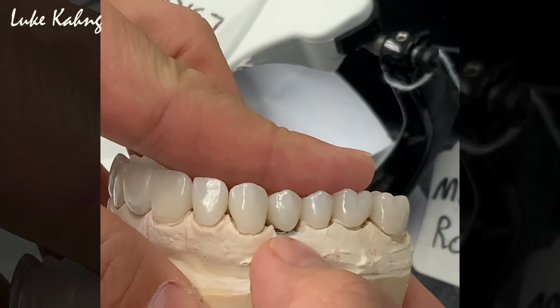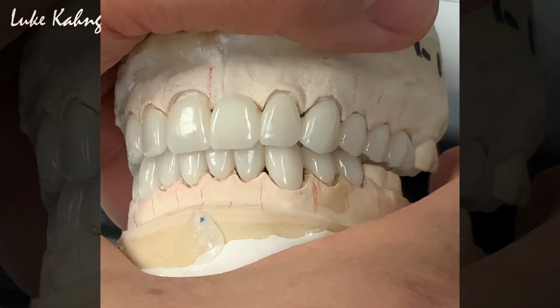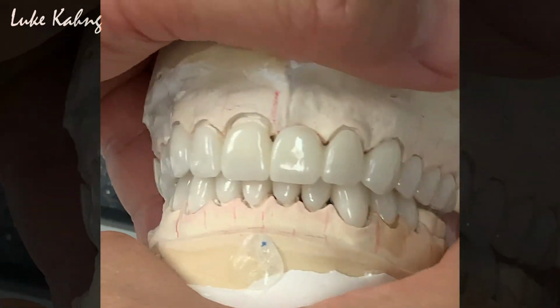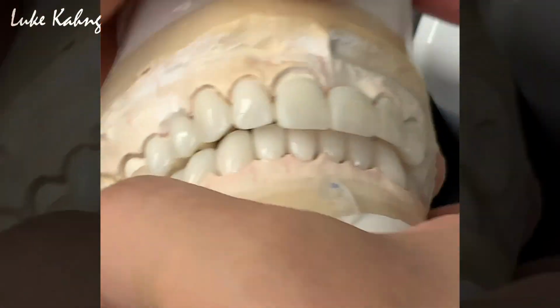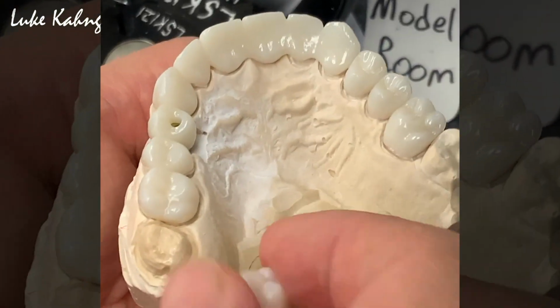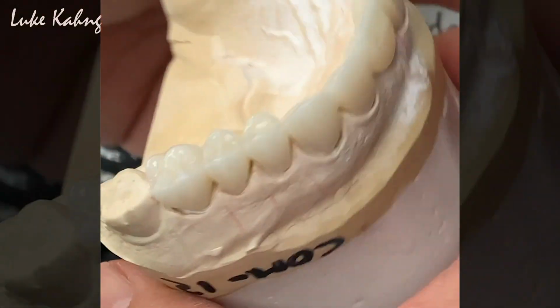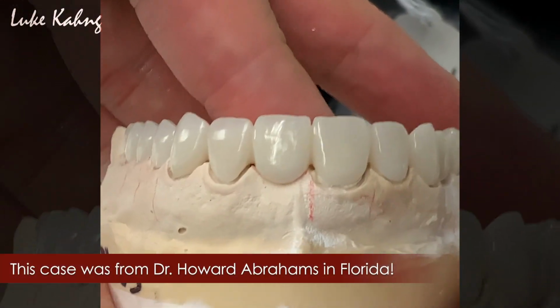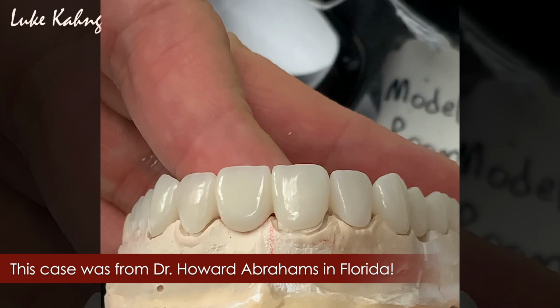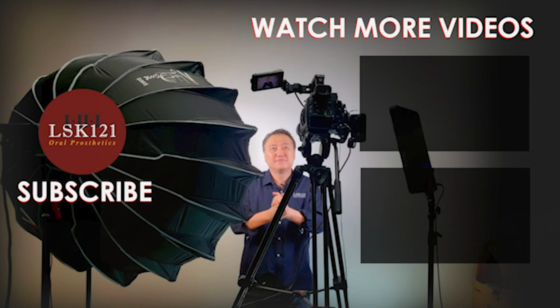So we make the cosmetic reasons for the facial. So another piece of art. Sorry, not piece of case. Piece of art cases. Finished. Okay. And you can see later the after-cement result. We can update it for the final one. Okay, so this is the final contours, pontic design, everything's done. It's a nice job.